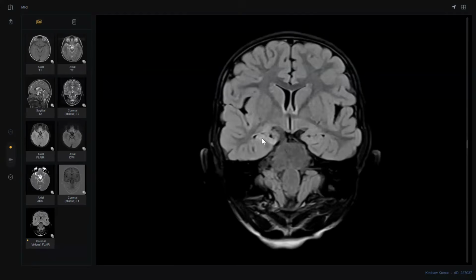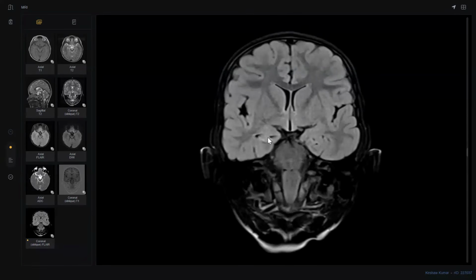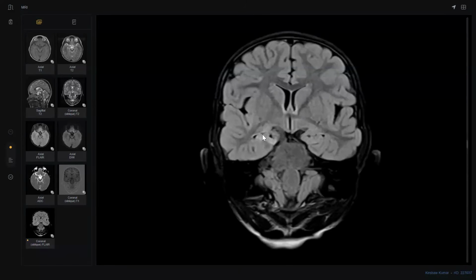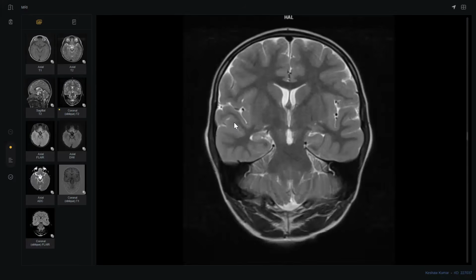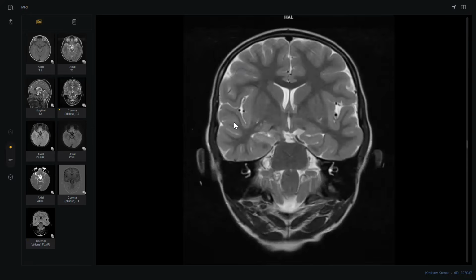What else do you see besides the abnormal signal inside the hippocampus? You must be more descriptive. Sir, there are abnormal signals, and mild widening and prominence of the temporal horns because of the sclerosis that has affected the parenchyma.